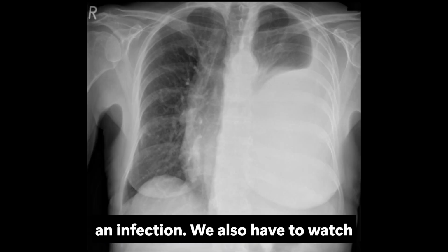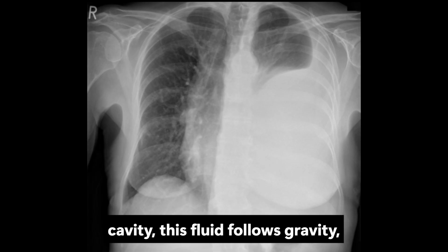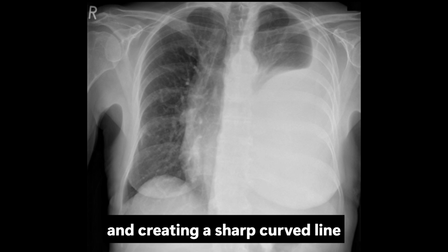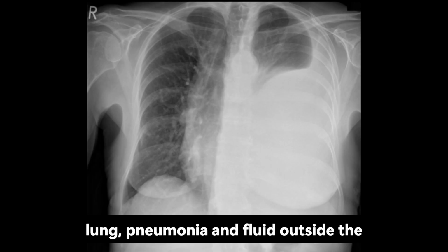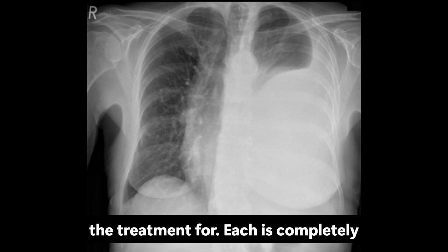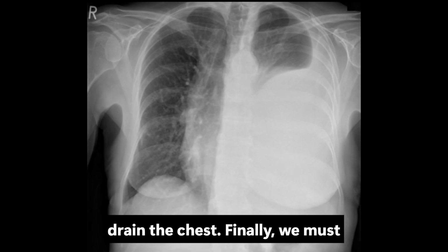We also have to watch out for pleural effusion, which is fluid outside the lung in the chest cavity. This fluid follows gravity, usually sitting at the very bottom and creating a sharp, curved line known as the meniscus sign. Distinguishing between fluid inside the lung, pneumonia, and fluid outside the lung, effusion, is critical, as the treatment for each is completely different. One requires antibiotics, the other might require a needle to drain the chest.